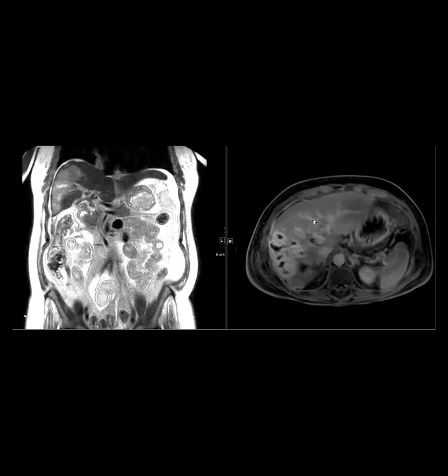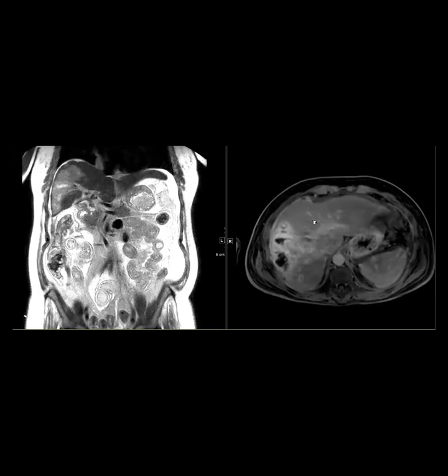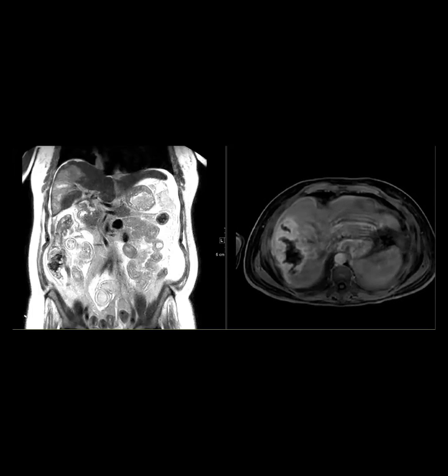I have a question about the portal vein transection that led to this ischemic region. Normally, we think if there's an acute portal vein thrombus, the hepatic artery takes over and it doesn't get ischemic like this. Do you think it's because it was literally transected? This is almost like a mini ALPPS of a segment, where they acutely necrose it, or do you think the hepatic artery also got hit?